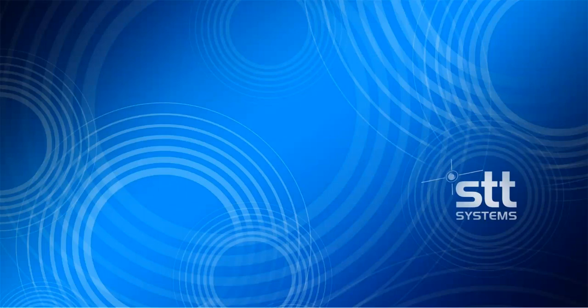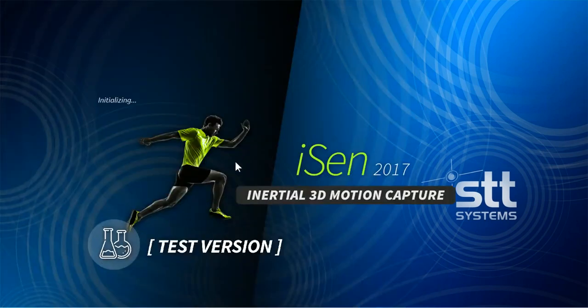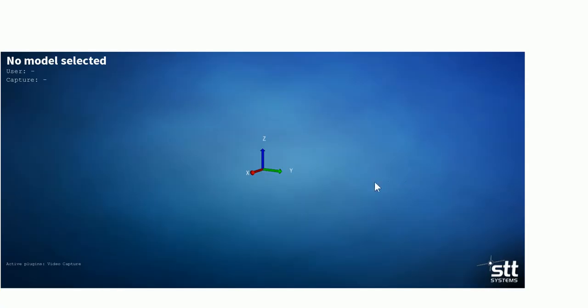Welcome to this very brief and quite simple introduction on iSen. I'll try to explain how the workflow is carried out in this software, how to use the sensors, how to display the different data sources, how to export information, and so on. I'll try to give a brief overview so that anyone interested can understand the different modules and possibilities of this application. So I'm going to run iSen 2017, the latest release version as of now.